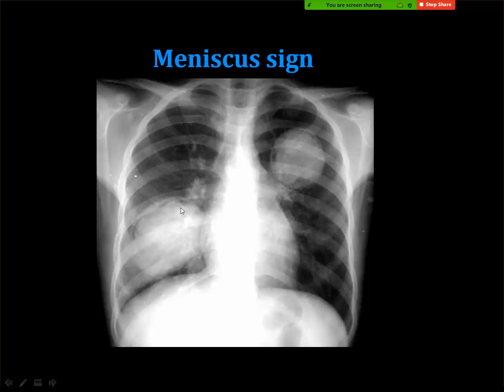But this is air in the wall of the lesion. This is one of the old cases in my archive, but in the current days I haven't seen a similar case. This is quite different from the fungal ball.